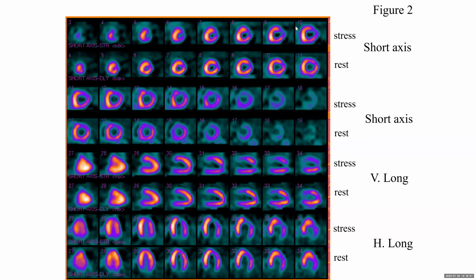Upon ischemia in one small area, the rest of the segments will compensate for that by increasing the contractility. When you start to have other segments affected, all of these segments will actually dilate in response due to that stunning. The whole myocardium is stunned, so the response is always stretching and dilatation. So TID is another one that you have to look at. Eyeballing for TID alone is not really recommended. However, if you are able to appreciate that the LV dilates when it's supposed to be shrinking or smaller, then this is a sign of high risk.